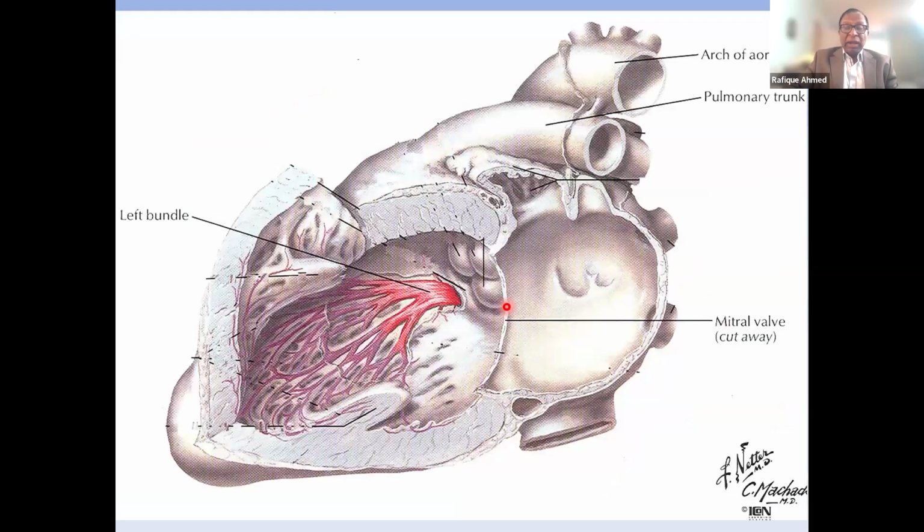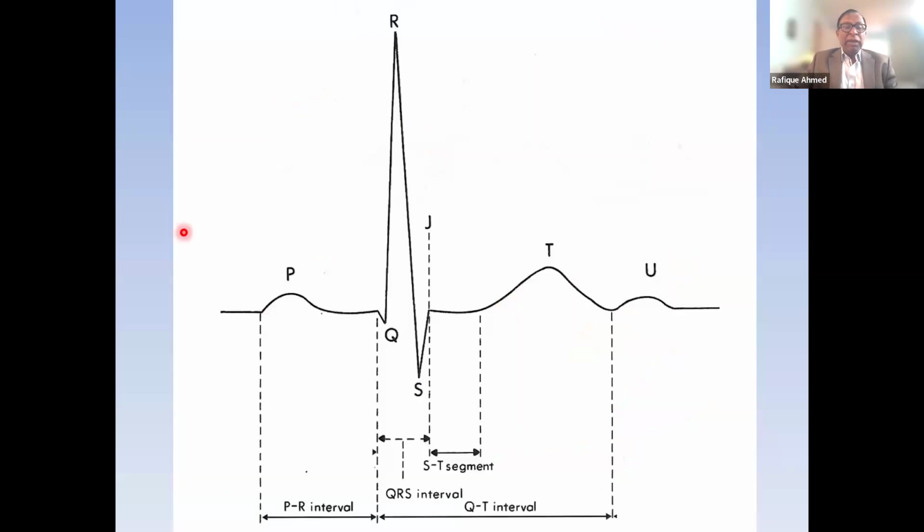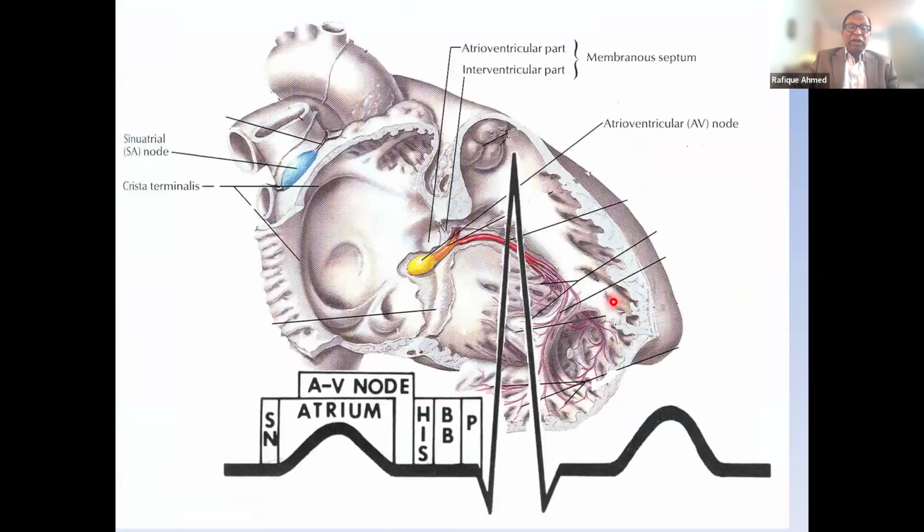Now the heart. So this is the ECG. We can see P wave, QRS complex, and then QT interval, basic structure. And which part? I look at this picture. If you look at the P wave, it is atrial activation. However, AV conduction starts pretty soon as the P wave is progressing, because remember, P wave is the activation of both right and the left atrium.